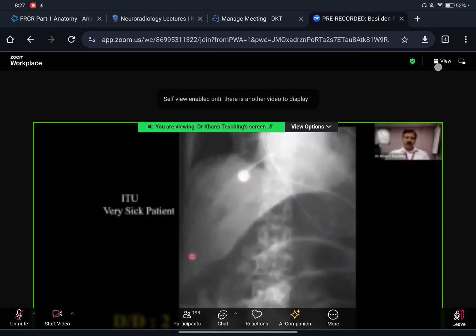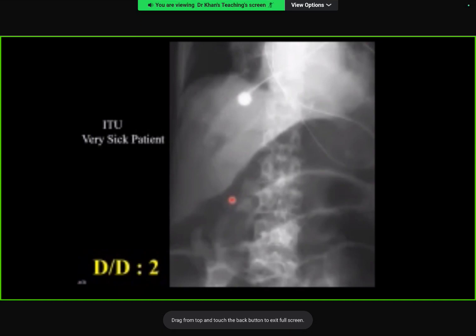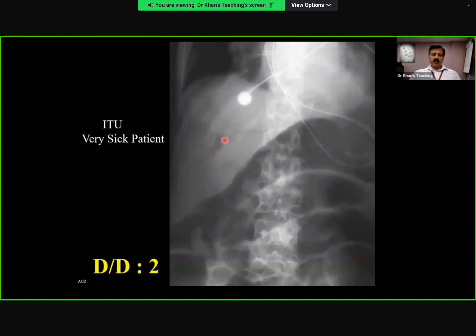Happening here? So there's a liver shadow, which is obviously obvious, and then there's a gas shadow, whether it's biliary or I think it's not biliary. It's outlining the liver, this shadow. Okay. This thing is something which is a point of discussion. But if you see these loops of bowel, yeah, they're dilated and gas filled.